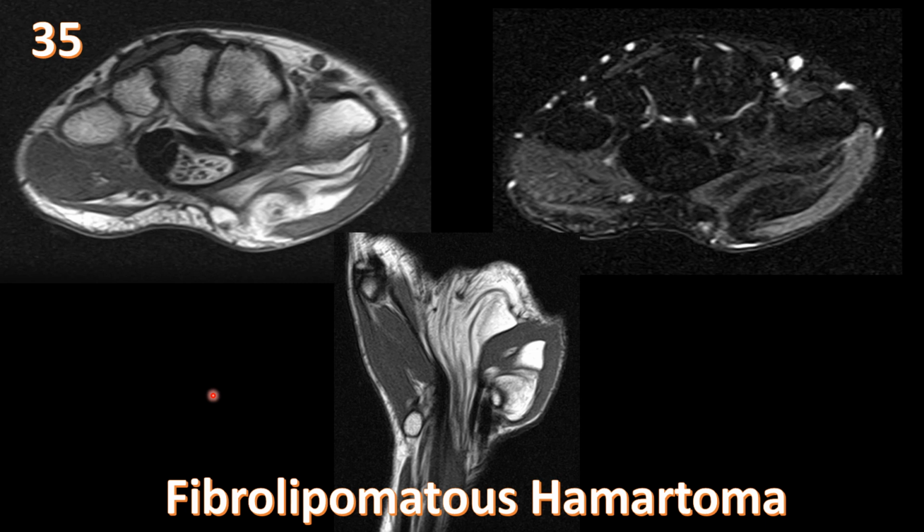And this comes in the test because the imaging findings are very, very characteristic of the diagnosis, and also because it's associated to macrodystrophic lipomatosis and macrodactyly.